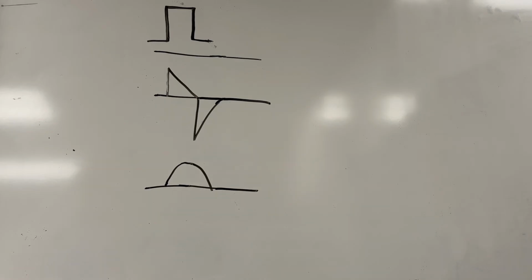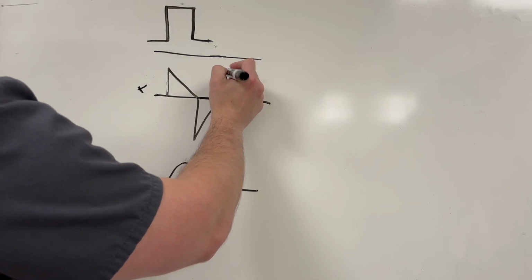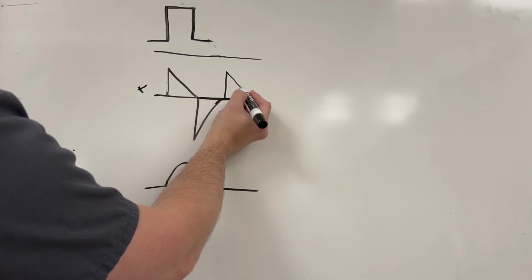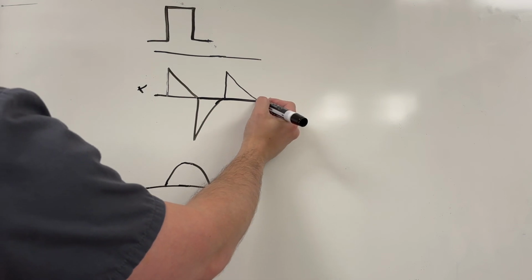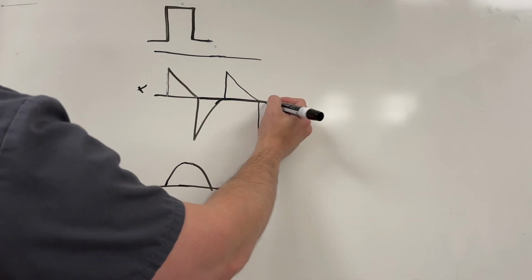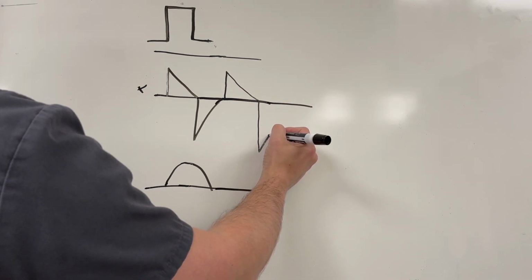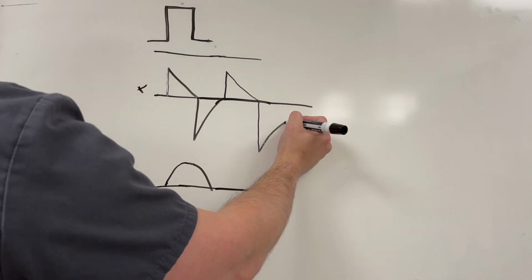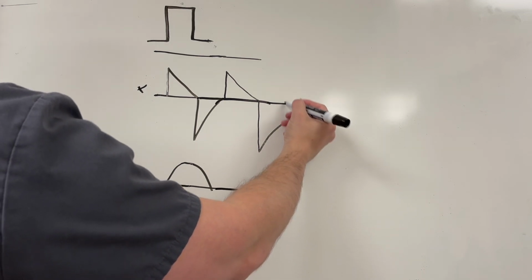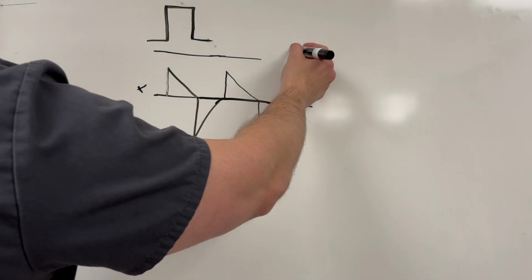Now let's look at how trapping or auto-PEEP is represented on the waveforms. This is going to be on your flow waveform. We go into our inspiratory phase, decelerate smoothly to zero flow, and then go into our exhalation phase and hit our peak expiration there. Then we're going to start exhaling, exhaling, exhaling. Well, if the next breath starts right here, then it would go like this, and then go into your next breath.